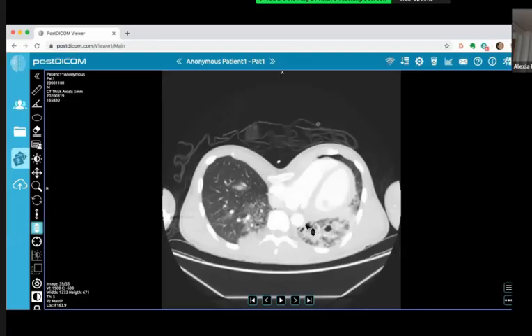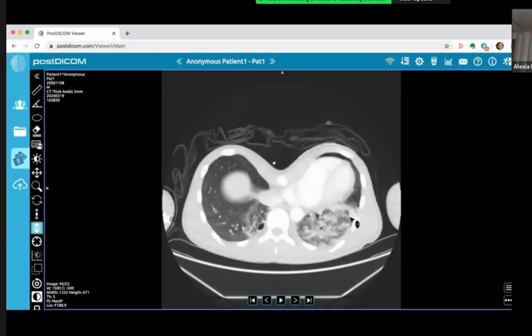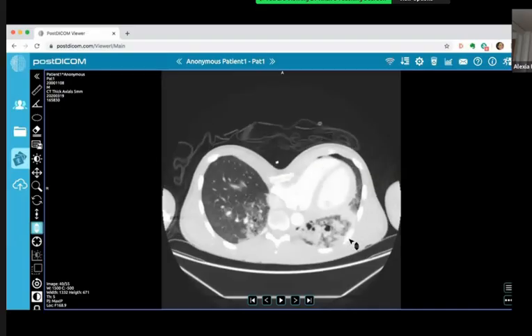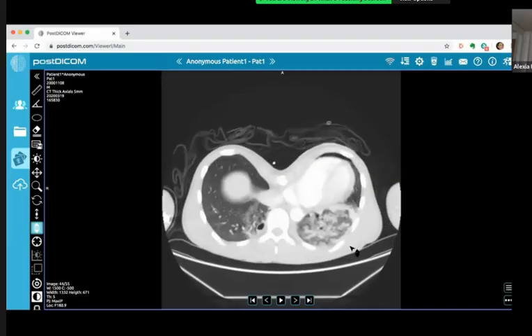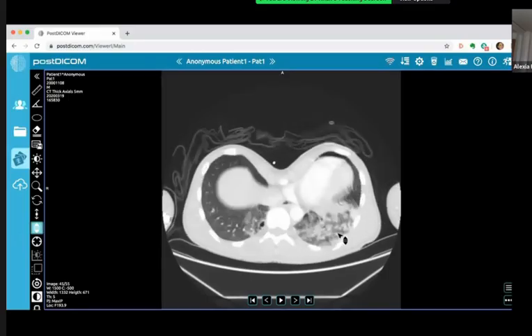That's right. These cystic spaces represent post-traumatic pneumatoceles. There are, as you said, extensive contusions and consolidations bilaterally. If you window it, there's no active hemorrhage into this region. But as you said, the predominant lobe involved by this chest trauma is the left lower lobe.